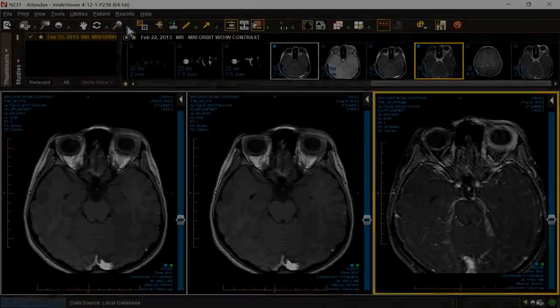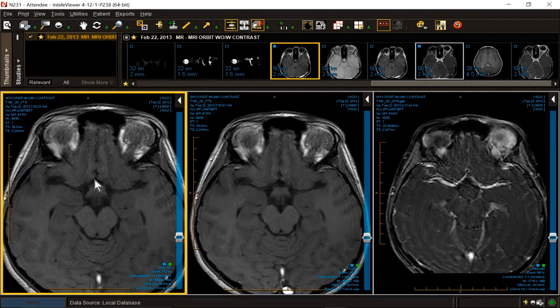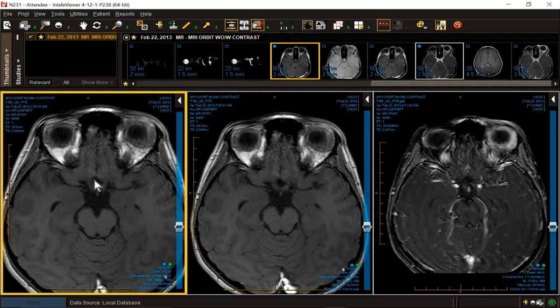So whenever I see a lesion that looks bad and the patient looks good, I think of sarcoidosis. When it's weird and I don't know what to say, I say, yes, dear. And I also say sarcoidosis. This is sarcoidosis. So it's a quick one. It's a diagnosis of exclusion.